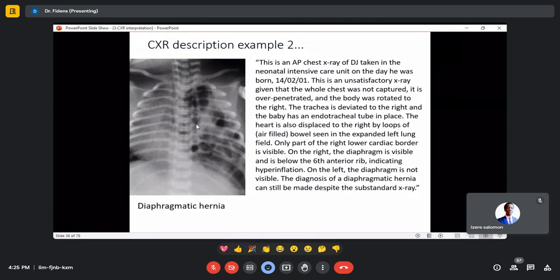Don't you see that it looks like intestines? They look like intestines in the chest, and they are the intestines in the chest. For a kid like this one, those are intestines, and again, we don't see very well the outline of the hemidiaphragm on the left side.